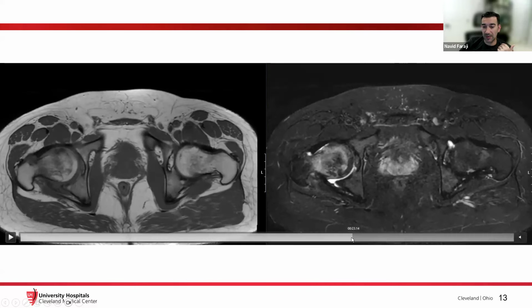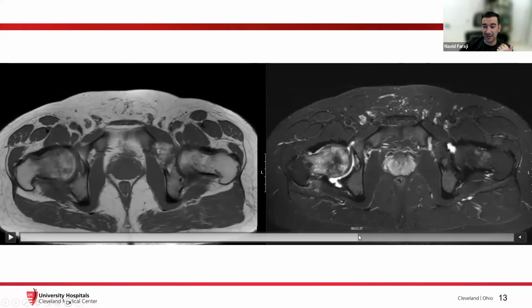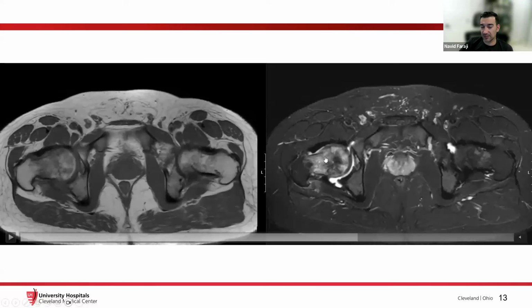So I'm just going through that pattern and seeing if they're normal and low signal intensity, then that's great. If they're a little bit gray, then maybe there's some tendinosis. If they're frankly disrupted by fluid, you can see fluid is bright here, then that's a tear. And we're going to talk about varying degrees of tear. We talked about T2s showing us pathology. We can see this femoral head is really bright and this femoral head is really dark. So this is normal, and this is abnormal.